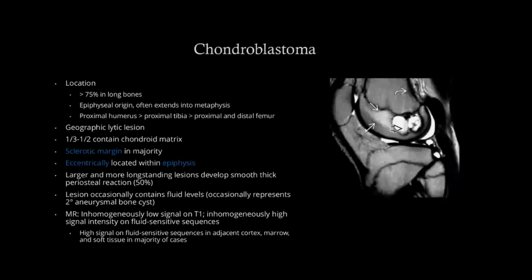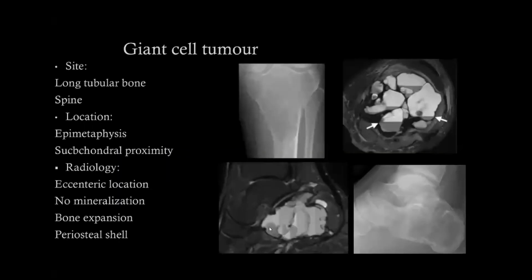Okay. And if there is a sclerotic rim, it will have low signal in all pulse sequences. Okay.